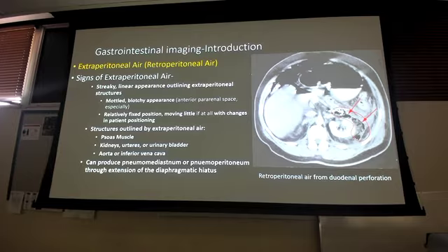So this is not going to rise up because it's extraperitoneal, so like retroperitoneal, it's in the back area. Diaphragm's up in the front area. This is in the back area, so it's not going to rise up underneath that diaphragm really well. The key thing with this one is a lot of times you'll see your psoas muscle really well. Okay, you can sometimes see your kidneys pretty well.